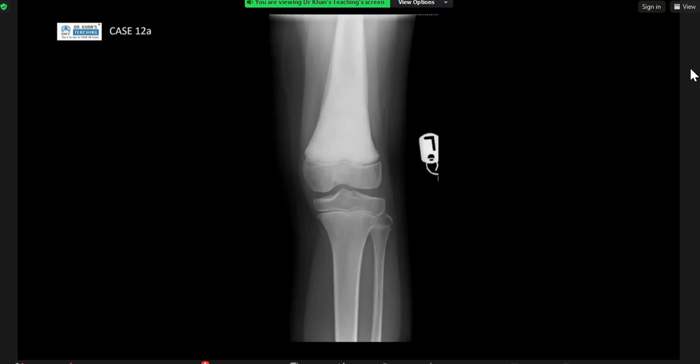So I'm given a frontal radiograph of the knee joint with distal femur and proximal tibia visualized in a skeletally immature patient, and I can see generalized sclerosis of the distal femur, metadiaphyseal region with a band-like lucency running beneath the cortex and the sclerosis of the femur in the diaphyseal region, and the rest of the epiphysis and tibia fibula appear normal. Soft tissues appear normal to me.